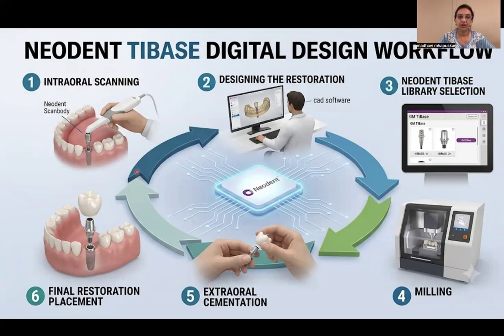In today's video, we'll be seeing how to optimize the digital workflow using the Neodent Tibase. The first step would involve scanning. The scans are then imported into the designing software, where you choose the correct components from the library and design the restoration. Once the restoration is designed, it is then milled.